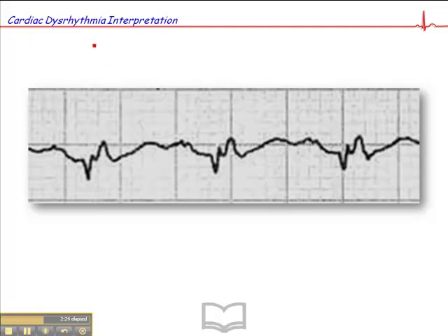Now, keep in mind here's some basic principles. QRSs are jagged, right? They have jagged edges. Jagged. I'm hoping I'm spelling this right. Jagged. Oopsie. Sorry for the line there. P waves tend to be smooth and rounded, as are T waves. So that's my terrible drawing there. Let me get rid of that.